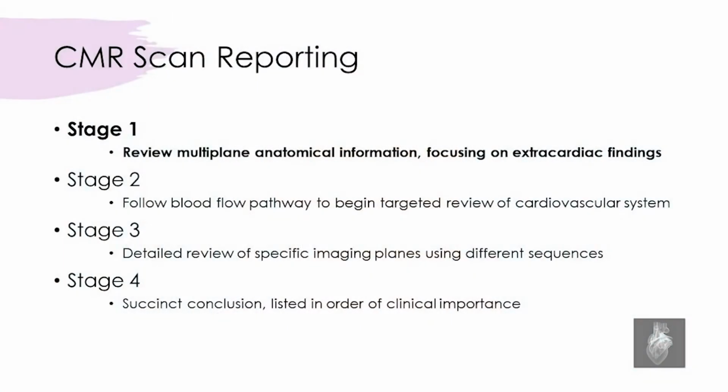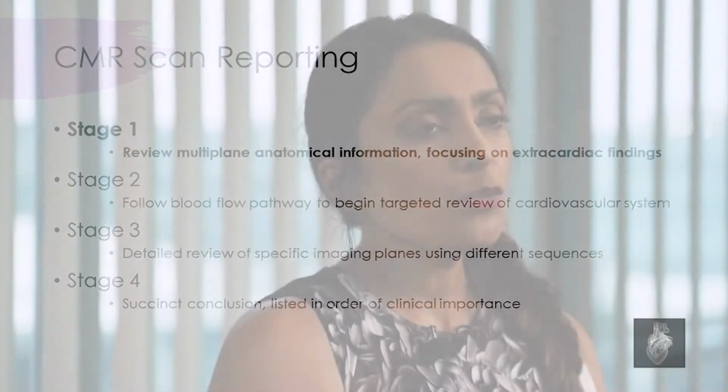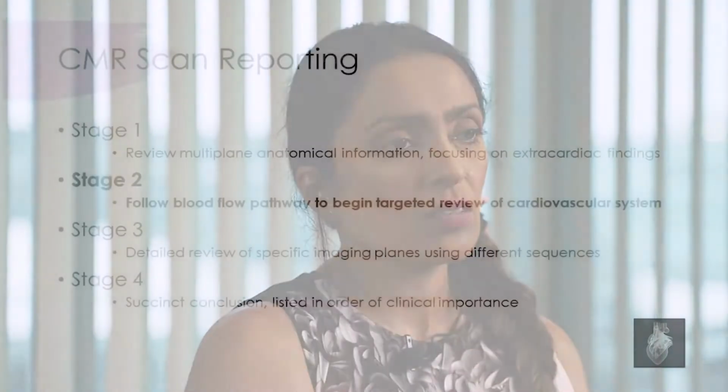Start scan evaluation by looking through all your multiplanar anatomical datasets. This is, for me, the optimal time to discover any extracardiac pathology. If you do see anything, note it down straight away into your reporting template.